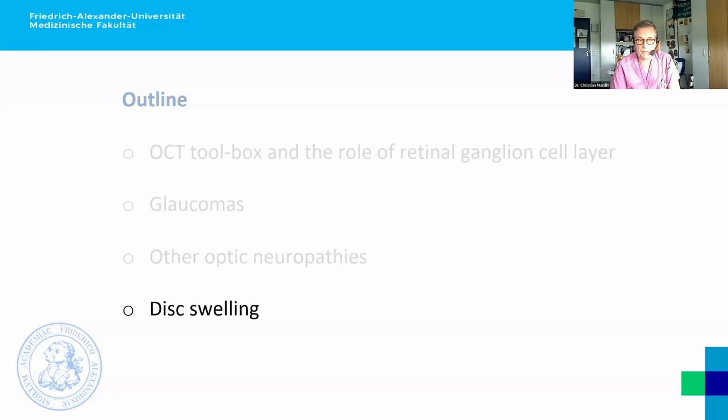As you see, you can't use ophthalmoscopy and OCT only on all these changes. You always have to use the visual field, which is very helpful, and all the other diagnostic tools you may have, going to MRI and all the neighbors, neurologists, otorhinolaryngology. You have to ask and cooperate with them in order to deal with the patient. But the first idea you get is from this kind of examination.